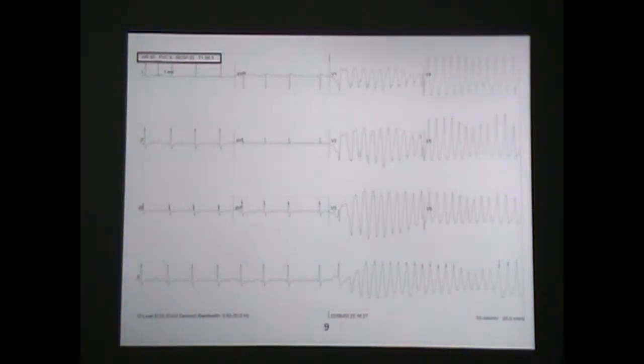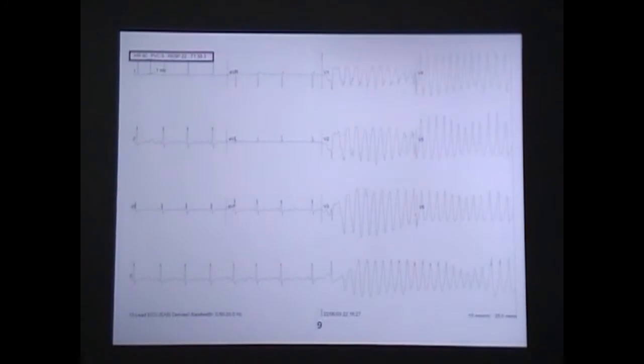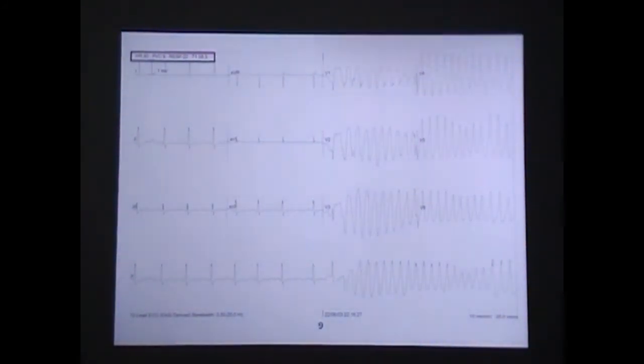All right. Check a pulse. What I like is that he's only got 9 PVCs. That's about what I counted, yeah. I just started laughing. So, what is this over here? When you look at that. That's VTAC. I heard someone say the correct answer. What did you just say? It's torsades. It is torsades.